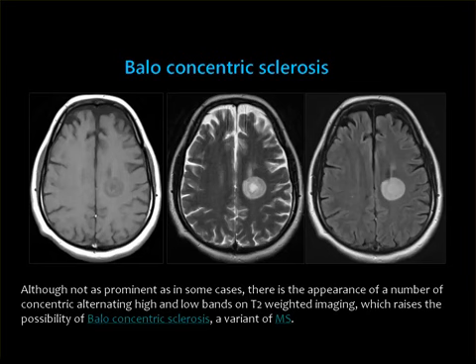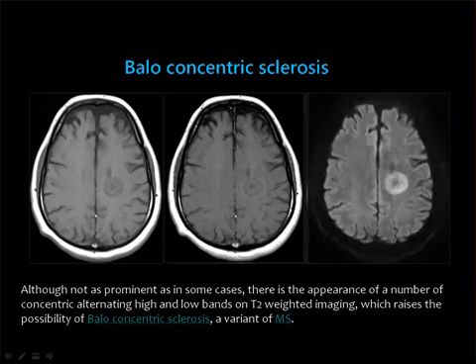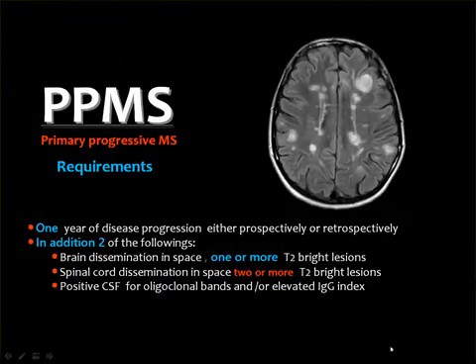And many times, if MS is not in your head, then you may proceed to diagnose other possibilities which are far away from the real diagnosis. If you inject the contrast material, you got faint marginal enhancement of the rings. And on diffusion weighted images, you got restricted diffusion, as you can see.